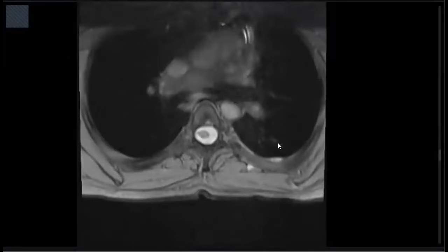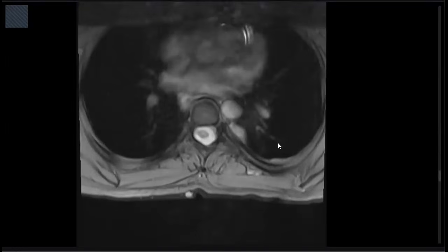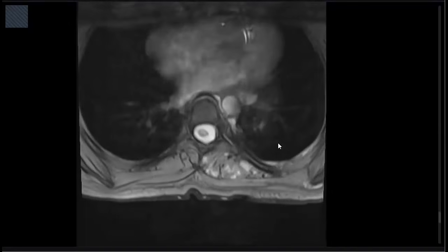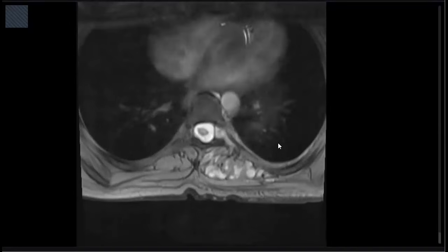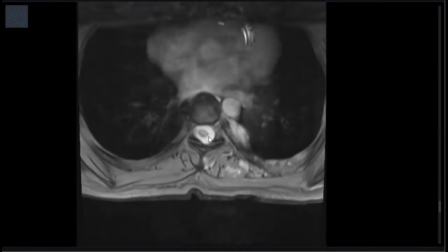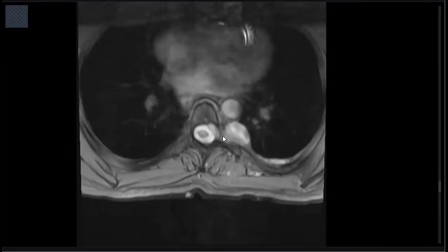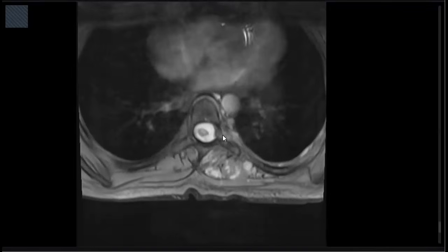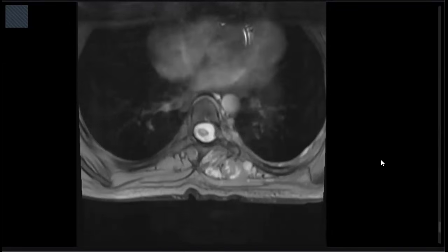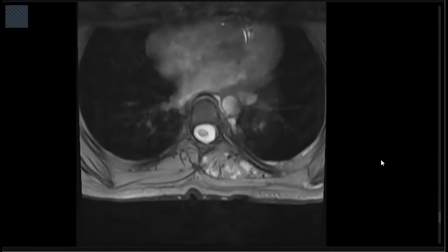What is the signal of lateral meningocele? They are T2 hyperintense. These are solid. These could represent neurofibromas. They are solid looking. What are the other features of this case?